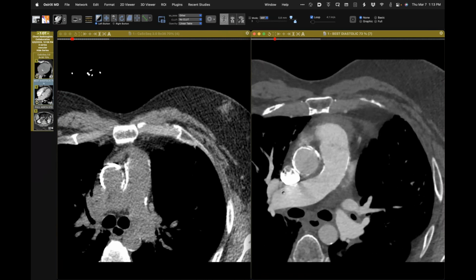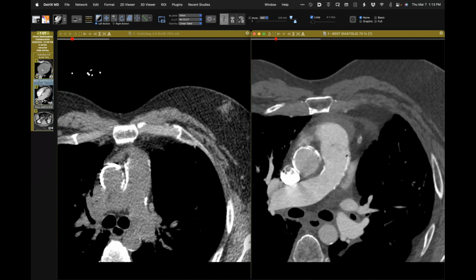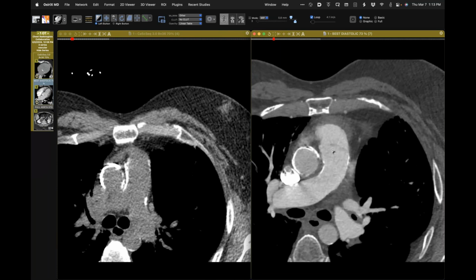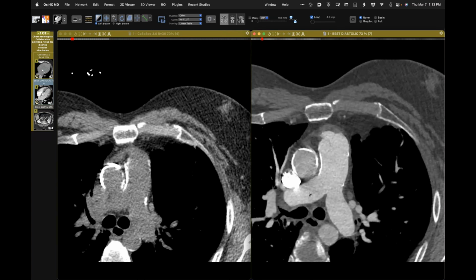Sometimes you can see it with atherosclerosis with longstanding pulmonary hypertension as well, but I don't think you've shown any curious correlation in location. Yeah, the calcifications don't exist in that shared adventitial sheath, right, with no other findings to suggest long-standing pulmonary arterial hypertension. But bingo, you got it right there, Jeff.